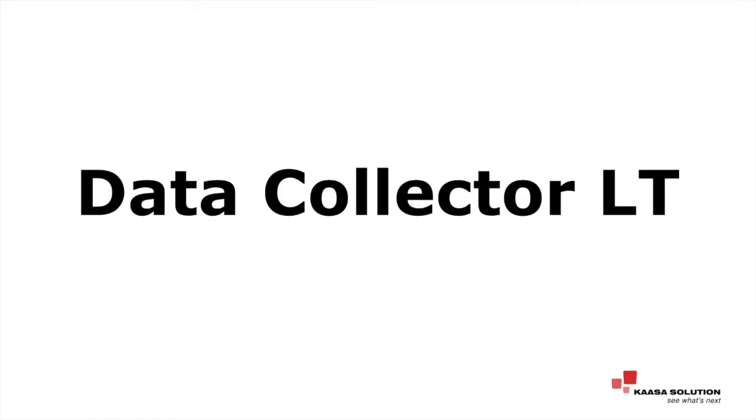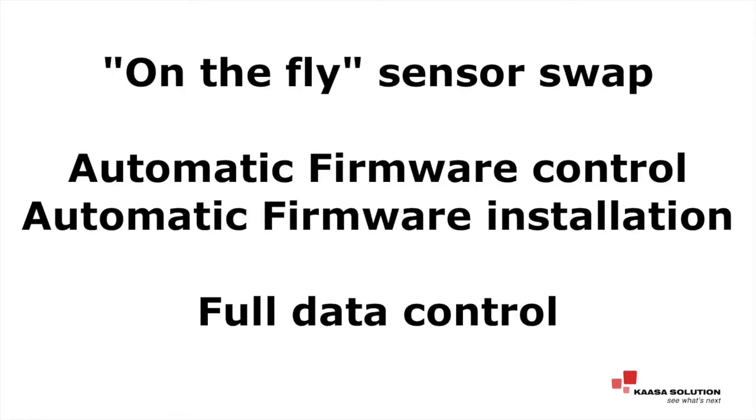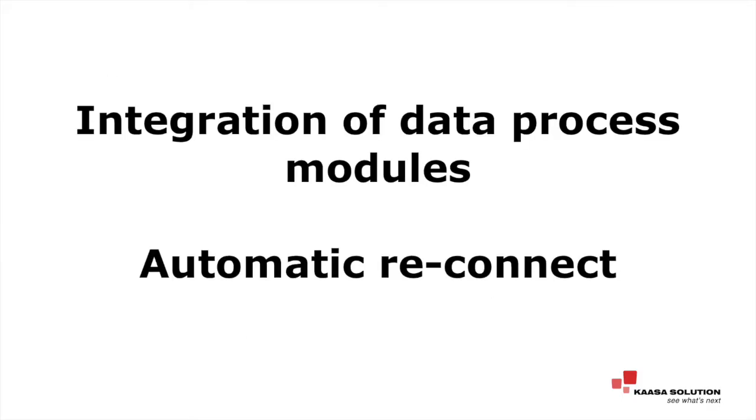This time we deal with the data collector LT. LT stands for long-term recording, so recordings that take a little bit longer, days, weeks, as you wish, really, at the end. The points that we look at will be on-the-fly sensor swapping, automatic firmware control, automatic firmware installation, full data control, and then we also go into integration of data process modules and the automatic reconnect module.